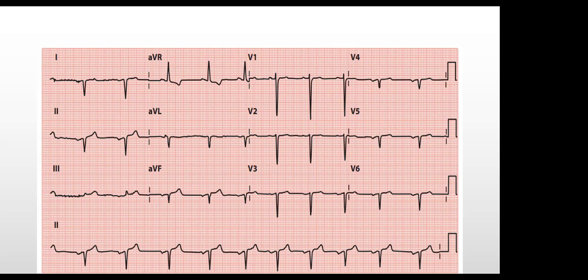Okay, let me try. I'll come to the rhythm later, but there's a P wave in front of the QRS, except that the P wave axis is negative here, which I think is part of the issue.